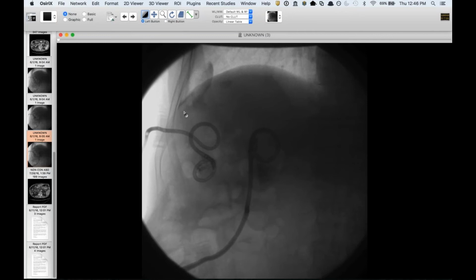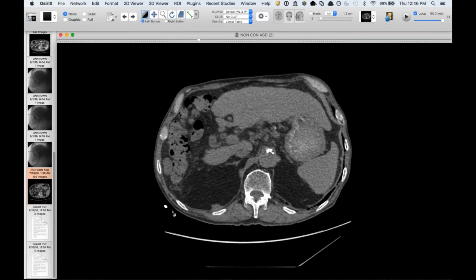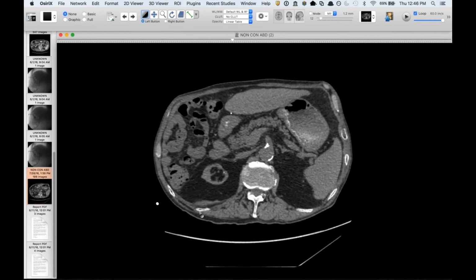And then these are the peritoneal drains. It may be that they placed it through the pleura when they did the drain check, to show that the contrast was actually in the pleural space. But I think that they're related to each other because he had the pneumonia before he had anything in his retroperitoneum, and he wasn't treated adequately. And now you can see that this is the most recent one that he's been treated and everything's improved.